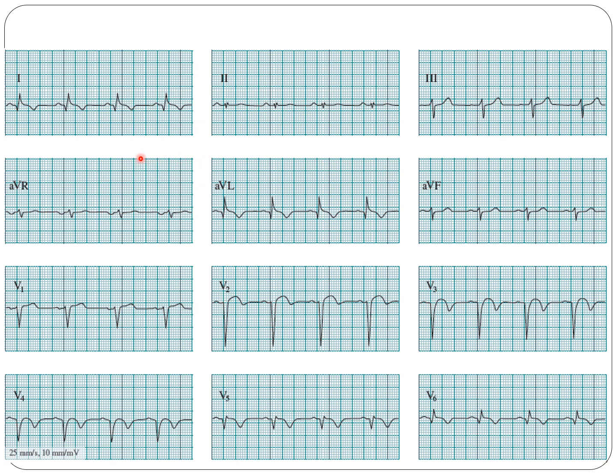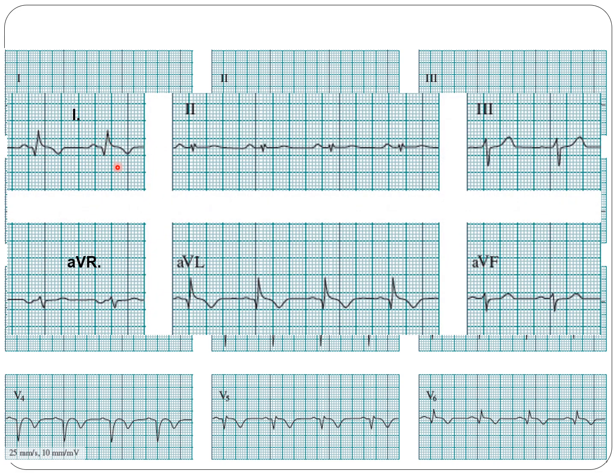The next one, again, the heart rate is rhythmic. Now the rhythm is normal. Again, we do have P wave, positive lead number 2, negative AVR, so this is sinus. The morphology of the P wave is normal, PR interval is normal, width of the QRS is normal.